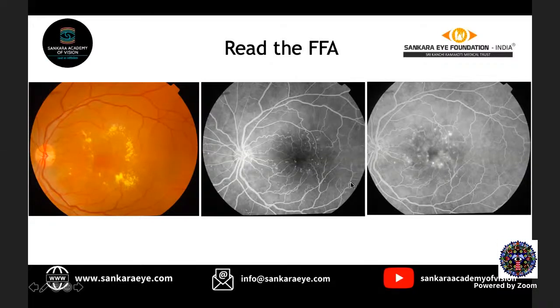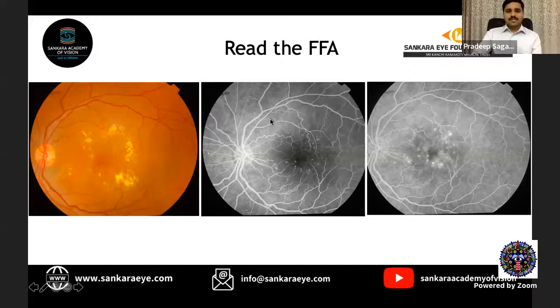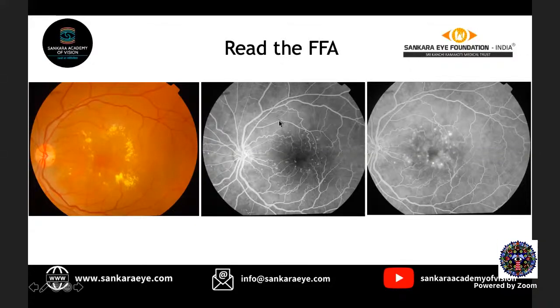We can also include which phase of the angiogram this would be. Very important. If all the veins are filled up, Sony, which phase should it be? Laminar flow, early venous phase, and this is the late venous. Laminar flow, yes, in the inferior part maybe, but it's predominantly early venous phase only. And the second one is the late venous phase.